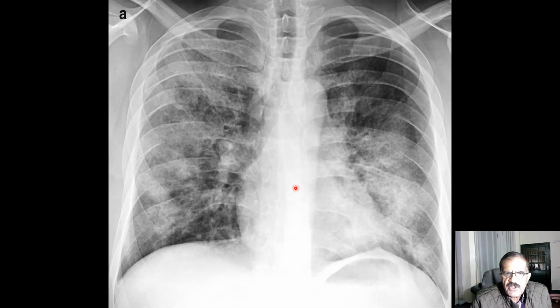This is another X-ray, very extensive infiltration on both sides. This is definitely consolidation, very typical consolidation, not corresponding to any particular lobe. Here there are multiple consolidations or one big non-homogeneous consolidation, bilateral pneumonias. Other possibilities can also be considered, but in my opinion, I would read this X-ray as bilateral pneumonia, particularly if the patient is febrile.